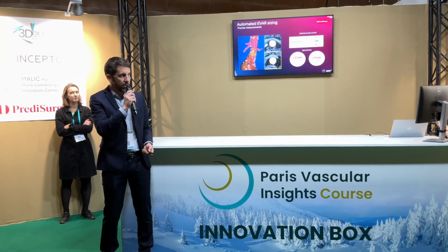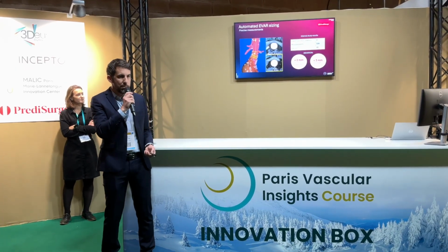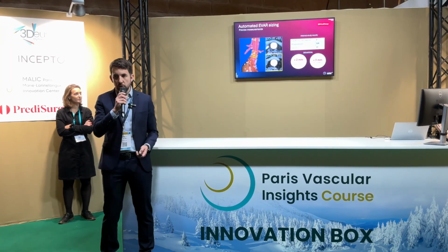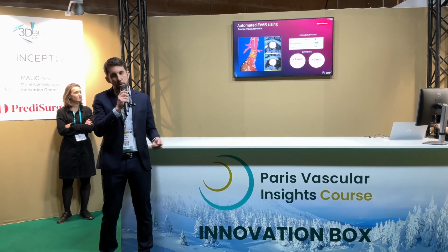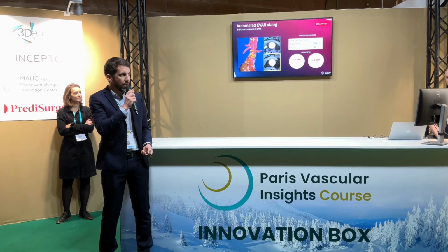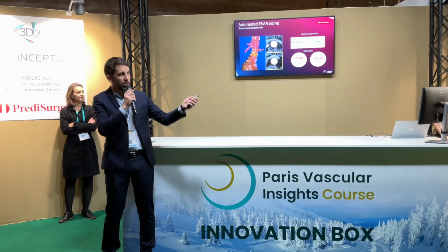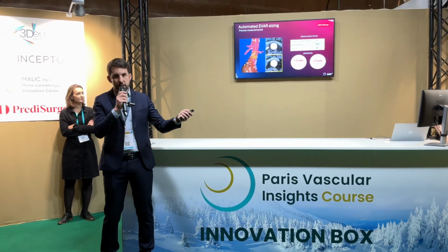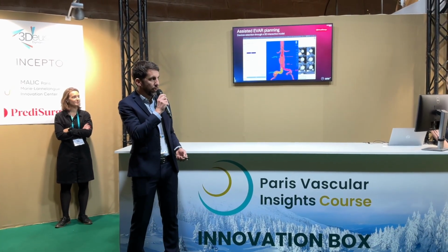And we did an internal study on 500 measurements, and you see that we have less than 2 millimeter differences in terms of diameter when you compare to vascular surgeon experts, and 3 millimeter for length, and it's about the same as the inter-operator variability. So for each slice, we do 100 measurements, and we compute the maximum diameter and the average diameter, and you will find this in all the reports.